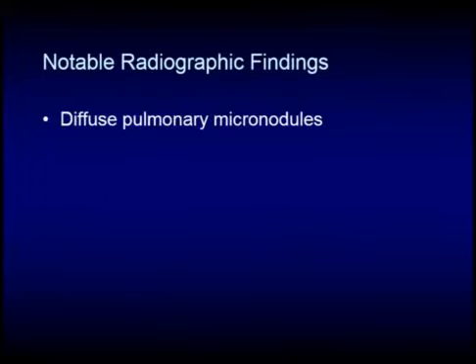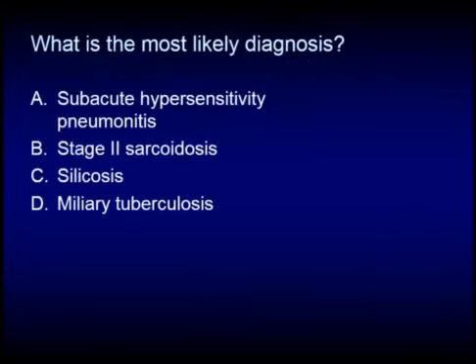And certainly in this case, it would be a hematogenous infection that would work. Hematogenous mets would be a possibility here. Certainly, usually there would be variation in the sizes, as Rob will point out. Occasionally, papillary thyroid cancer can give you very, very small millet seed nodules, not dissimilar, but often there, too, there is some variability and not necessarily these millet seed nodules, as we see here with hematogenous spread of tuberculosis.